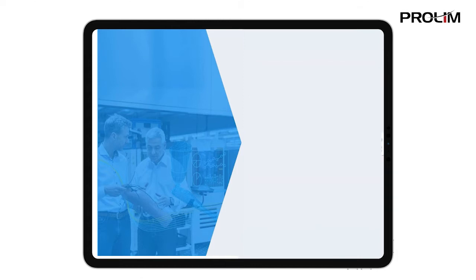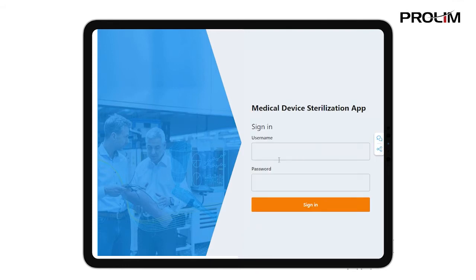We developed this app with a strong focus on the operator's user experience, hence the tablet mobile format. With all that said, let's get started.